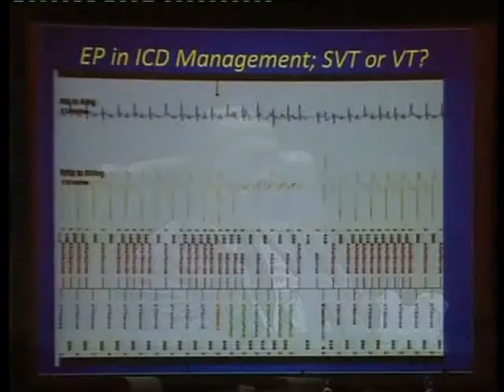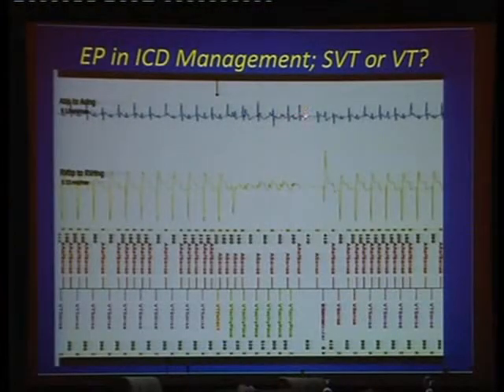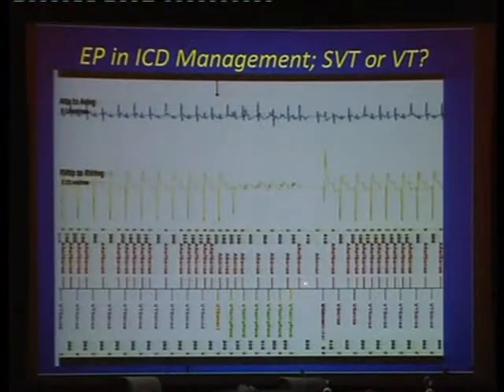So in fact, you're able to accelerate the A to the V pacing rate, and the next thing that happens is an A. So in fact, here is failed ATP, which shows a VAAV response. So you need to be, I hate to say this, but you need to have electrophysiology training. You need to want to study rhythms. You need to want to study electrograms and electrocardiography to recognize this is diagnostic of an atrial tachycardia.